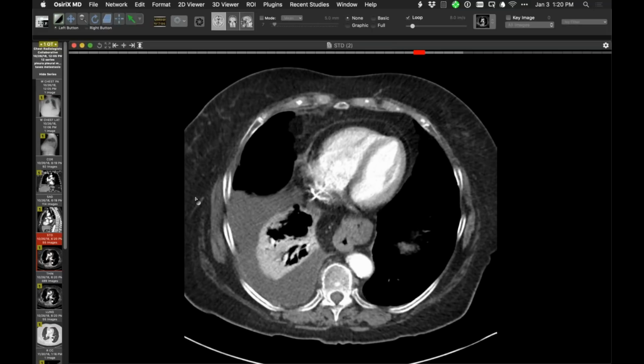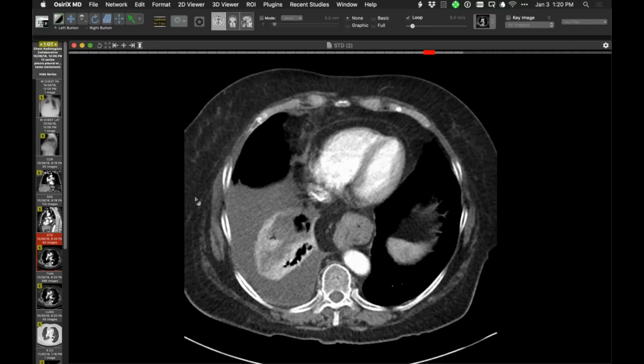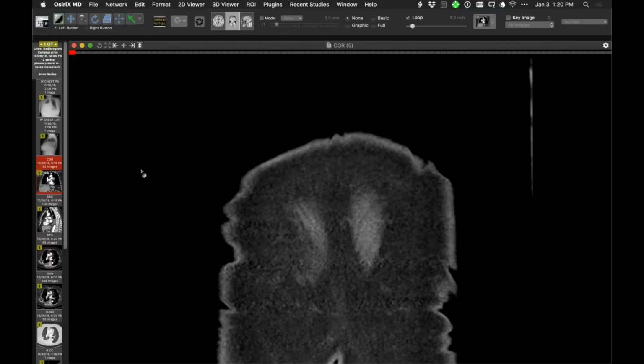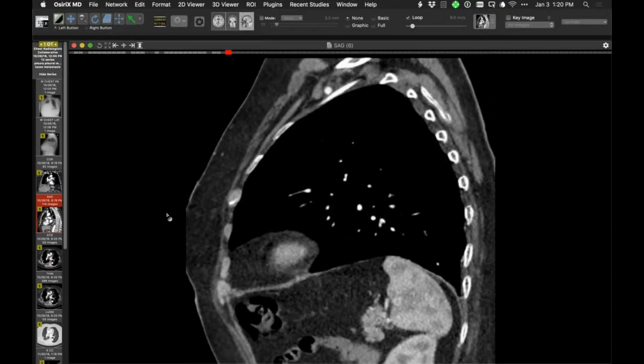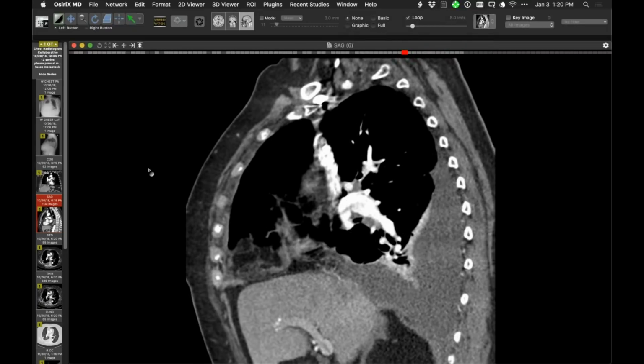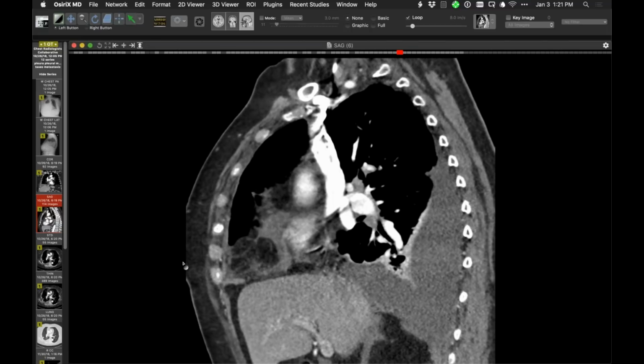The findings here are those you can easily go by unless you're looking carefully and paying attention to the pleural surfaces. So here an anterior pleural surface, for example, and even in the basal hemithorax. And the other thing that I teach now is that it can be very helpful to look at coronal and sagittal. So let me show you the sagittal first, for example. And if we go over to the right side, I think it's often easier to appreciate the extent of the pleural abnormality here involving the anterior pleural surfaces in the basal right hemithorax on that sagittal projection.